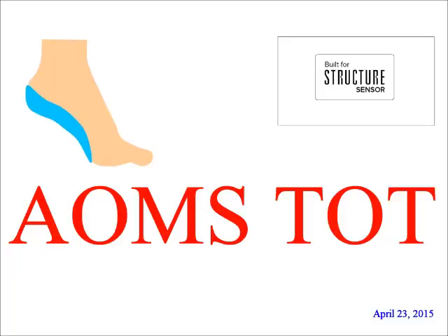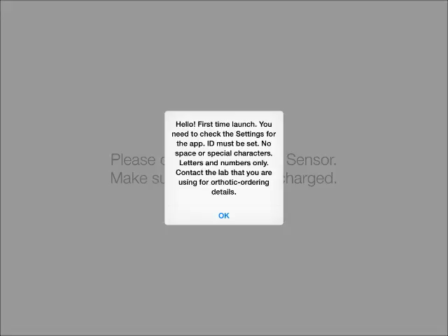Now let's get started. When you launch the app for the first time, you will see a message. It's a prompt to tell you that you need to take care of some settings to better use the app and the scanner. If you do not do anything with the settings, you can still use the app. Just tap the OK button.